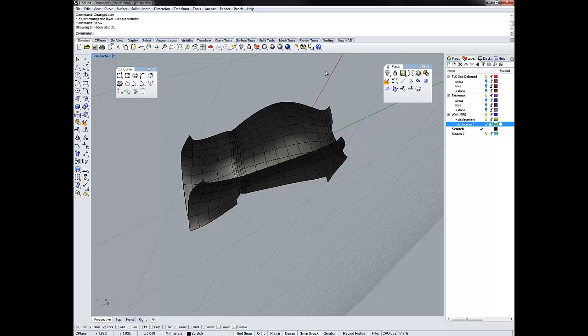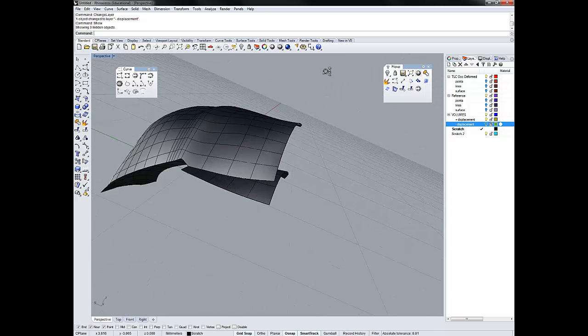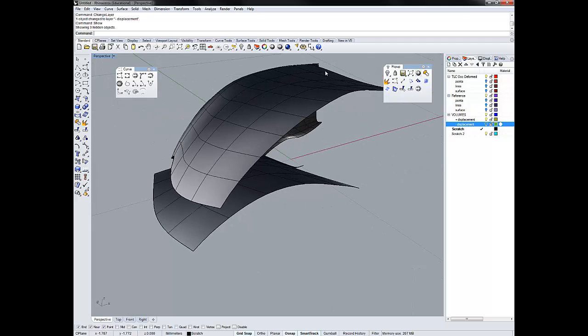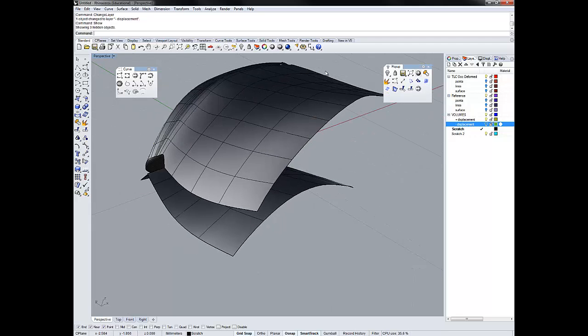What we need to do is go and draw lines that we will then construct surfaces from. So first thing to do is just draw lines. And since these markers are in the same place on each dog, what we're talking about is an actual sort of a translation and rotation. But this point is the same as this point. So we can, for the most part, actually just connect them. So that's what we're going to do. Still working on scratch layer. We're ultimately going to end up with this in the positive displacement layer. But for now, we're just connecting them.